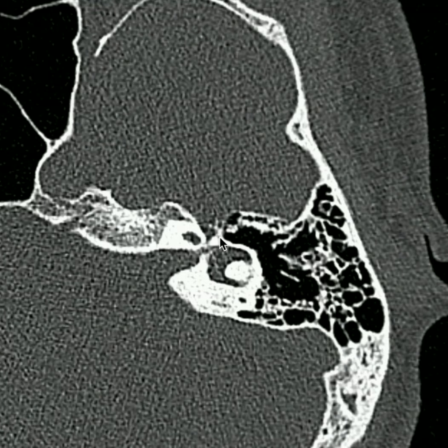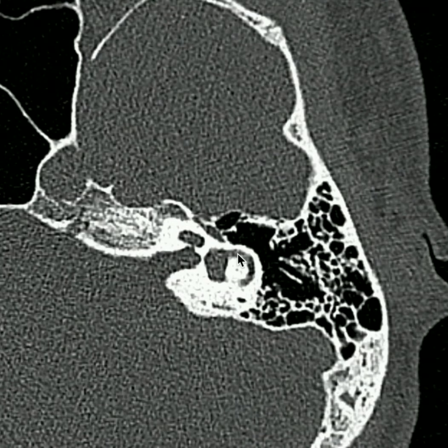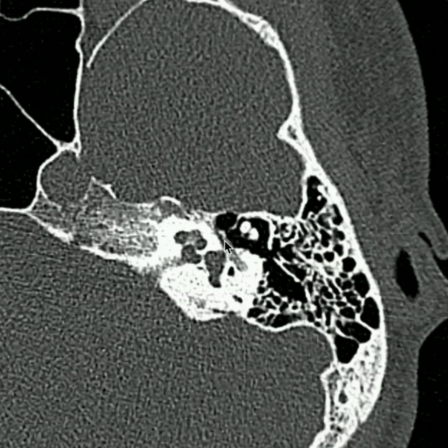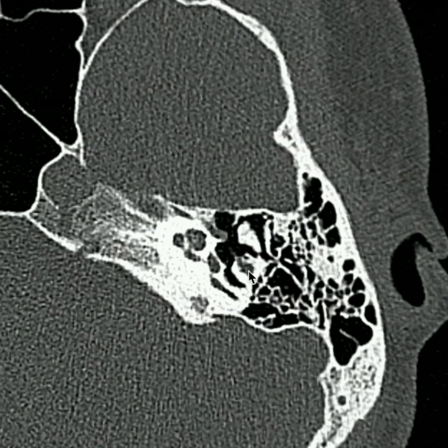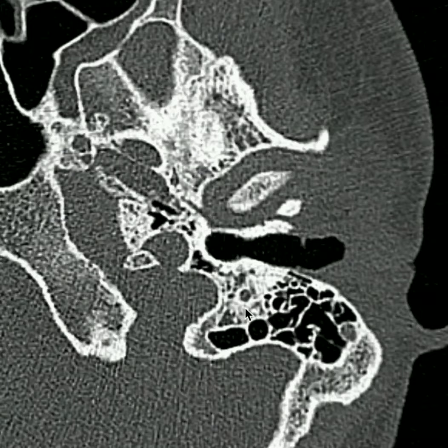This is where the tympanic segment of the facial nerve will also start coursing posterolaterally. So scrolling slightly inferiorly, we'll see the tympanic segment right here as it courses posterolaterally. Here it reaches the posterior genu, whereupon it becomes the mastoid segment, which courses inferiorly to enter the stylomastoid foramen way down here.